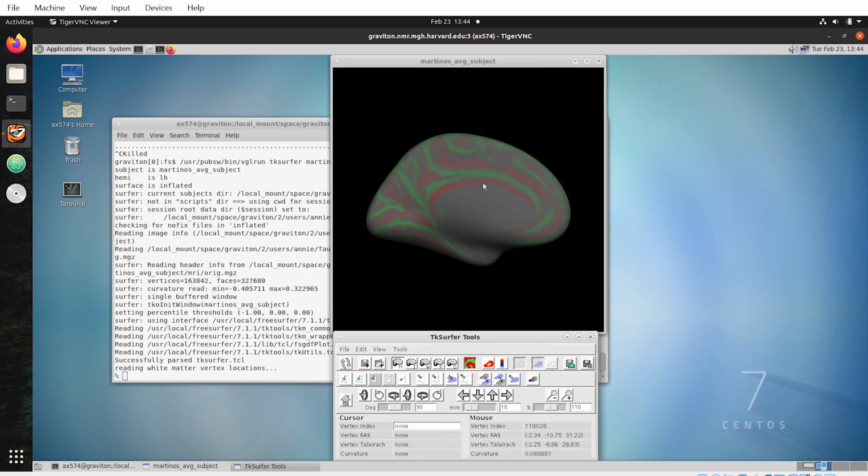So all you have to do is click around the border between the medial wall and this red sulcus, and then we will create one closed line with a cut, and then we'll fill in the area within here. It's basically filling it in, but actually it's ripping out the vertices.